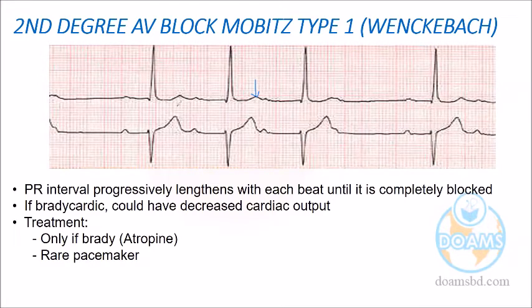Now, if we consider many other leads, as we discussed before, a rhythm abnormality, that means block, tachycardia or any abnormality in the rhythm, is better identified in the long lead too. The name is long lead so that we can follow multiple QRS complexes and the P waves. So if you see here, if you come down, very interesting, this is the PR, then the T wave, this is the PR, this is the PR.